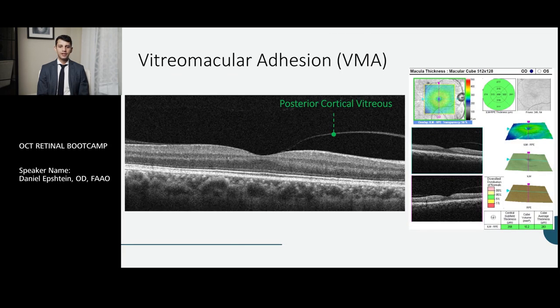So vitreomacular adhesion is something that gets thrown around a lot, but it's actually non-pathological. The vitreous and the retina are going to be attached in everybody at some point. And at some point, that vitreous is going to pull away from the retina, as you can see here. But if there's no changes to the retinal contour, it's just vitreomacular adhesion, and this is a benign finding.